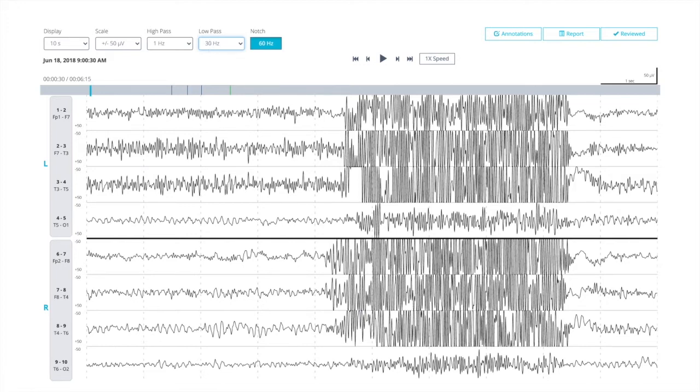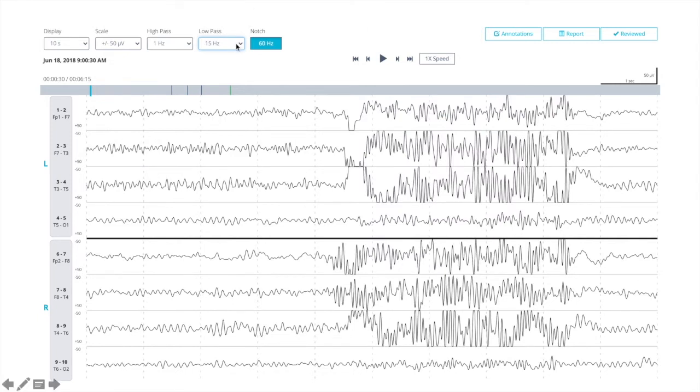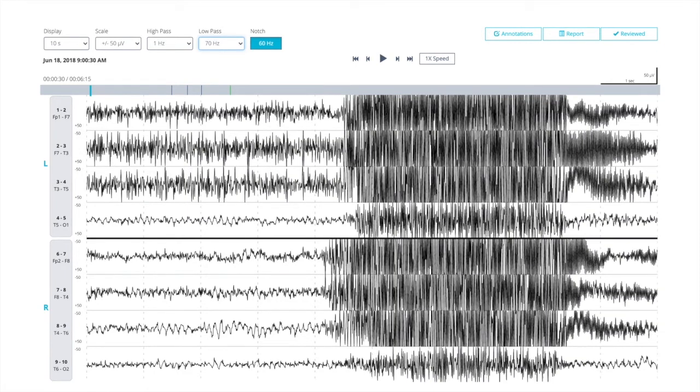If you go to 15 Hz low pass, it means you're not allowing anything above 15 Hz to pass. Waveforms almost look like brain activity, but very sharply contoured. This is not epileptic activity. It is byproduct of filtering it in a narrow range of 1 to 15 Hz. This can also be seen in conventional EEG very frequently.